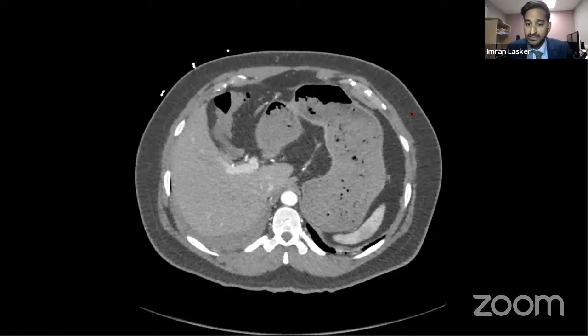However, when you go to this study, now you can see there is a difference, previous to current. But now, which phase of imaging is this? The aorta looks very, very dense. Compare it to the bone next to it, it's almost isodense, almost the same density as bone on this particular image. So we're actually looking at the arterial phase, where the contrast is mostly within the aorta. And therefore, this must be an arterial phase image.